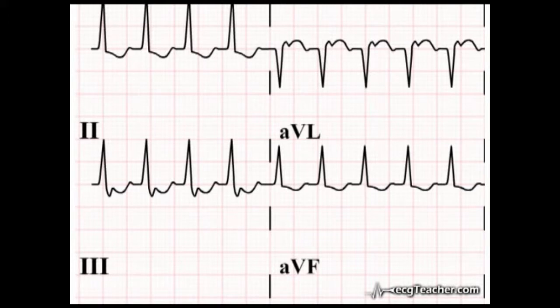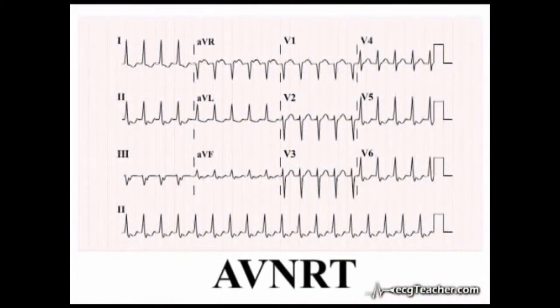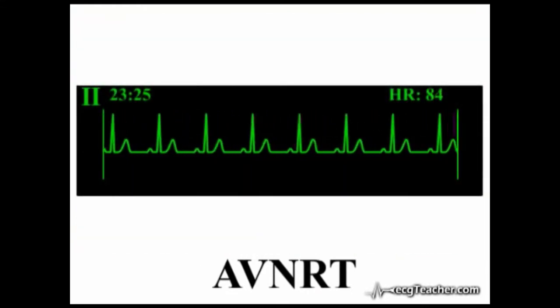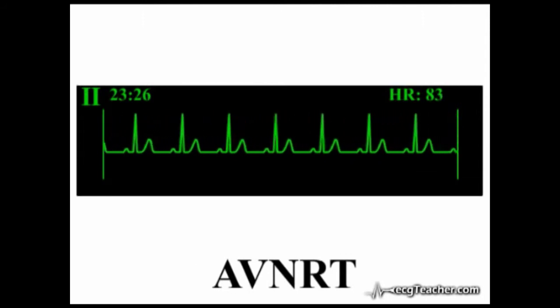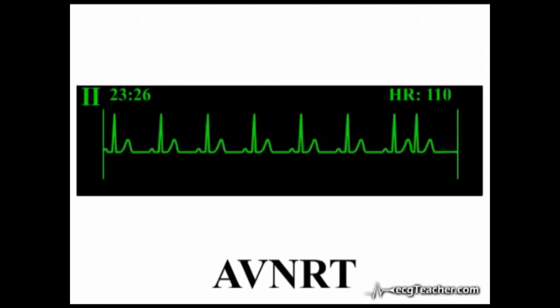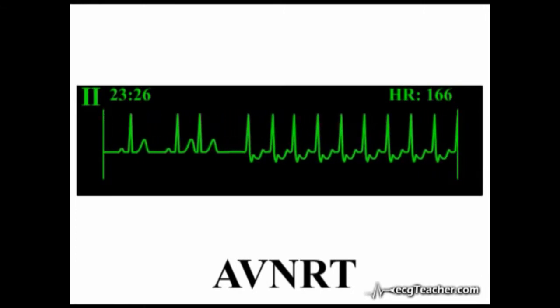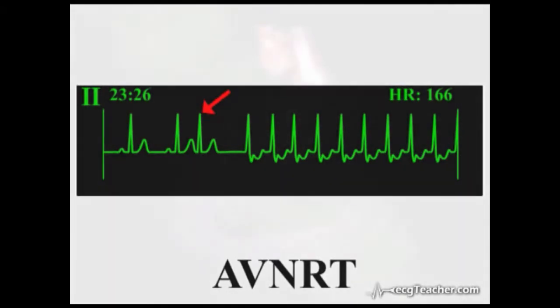At a heart rate greater than 140 beats per minute, the nature of the depolarizing focus within the junctional region is reentrant. This tachyarrhythmia is AVNRT. It is also worth noting that the readout from the patient's monitor captured the moment of transition from sinus rhythm to tachycardia and is very telling. Freezing at this point, we can clearly identify the premature atrial ectopic which triggered the arrhythmia.